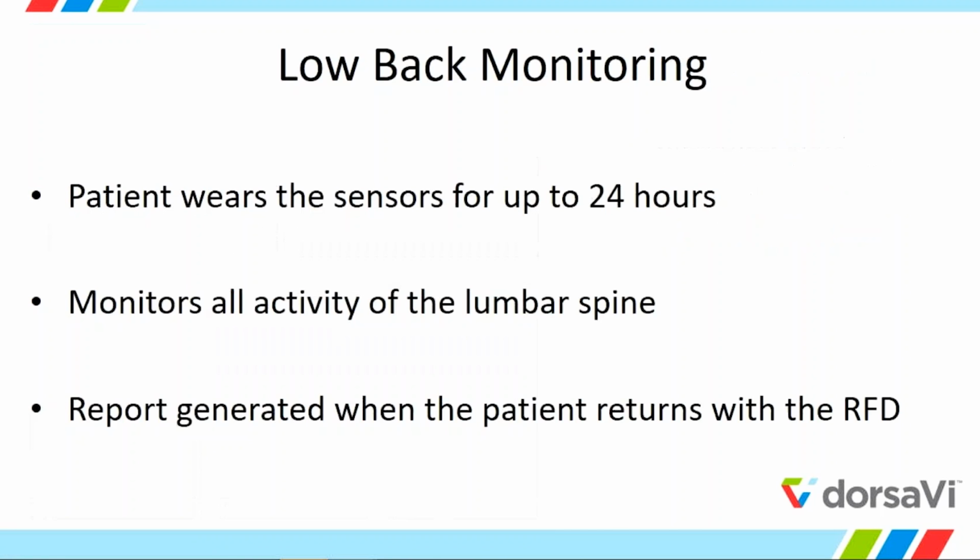So now, low back monitoring. This is where you can put the sensors on the patient and you take the RFD off, and it goes with them, because the RFD has to be within 10 meters of the sensors in order to record the information. And it can monitor all of their activity throughout the day for up to 24 hours. And there is a report that's generated. So the monitoring gives you really, really good information, and it's all about increasing awareness in your patients, right? So I always say that 80% of getting better is your awareness, probably even more, right?